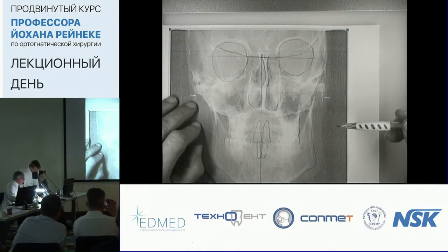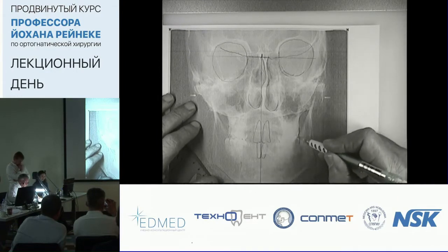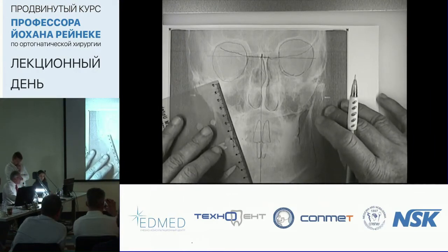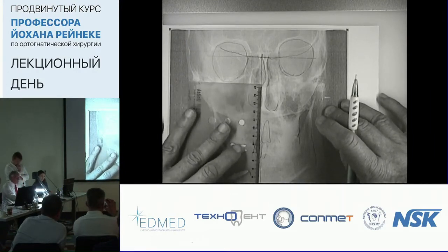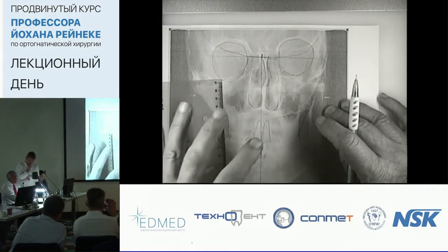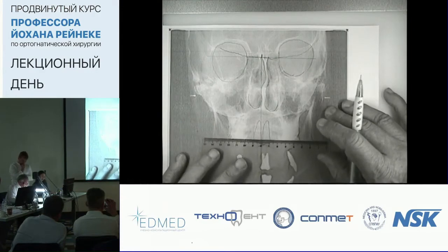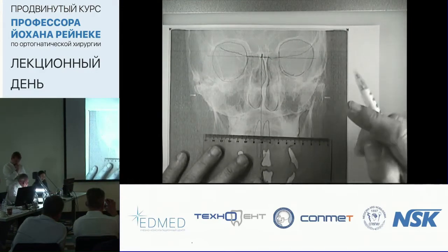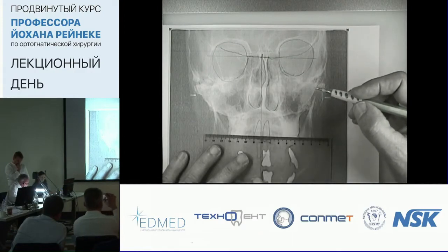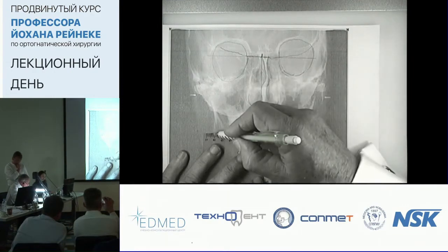Because to me it looked like he had a big cant. I'm not sure where the tooth is here. Now the important thing here for us is that it looks like the dental midlines, his occlusion is already aligned. So the midline, I don't want to disturb the midline, but I can see according to the clinical that to me there's a bigger cant on that clinical than I see here.